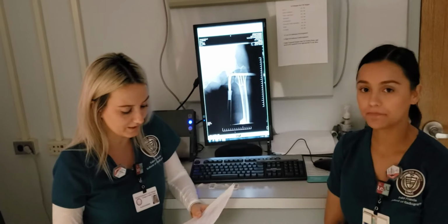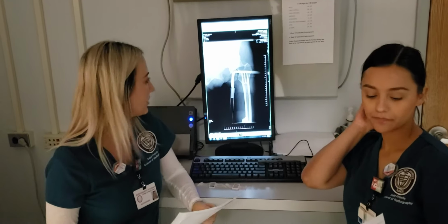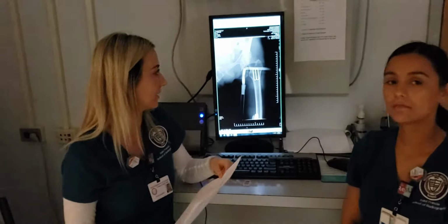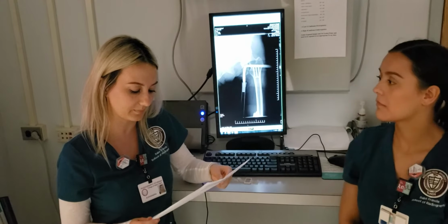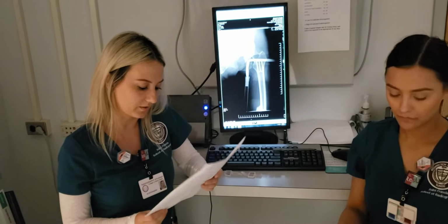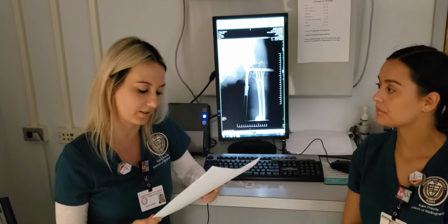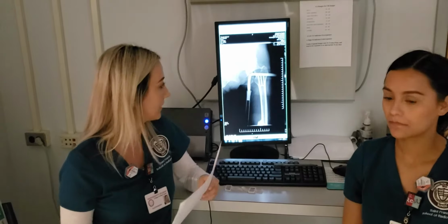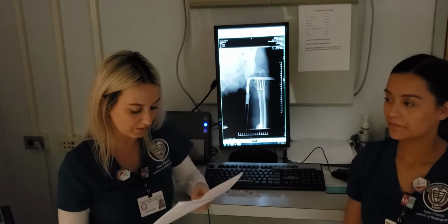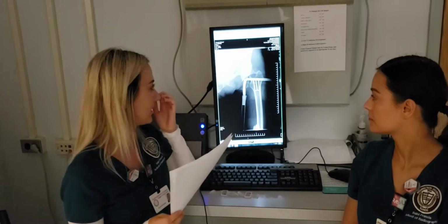Okay, so I'll be presenting the AP proximal femur. Are there any unnecessary articles? Yes, you can see the immobilizer, but it's supposed to be there. We're assuming that the patient came with that and it was probably put in by paramedics in the ambulance. She came in the ER. The central ray was perpendicular and entered at mid-femur, and it was centered in the center of the IR. There was no angle. The anatomical part is not oblique. Which body plane? It's AP. The top of the IR is placed at the level of ASIS.